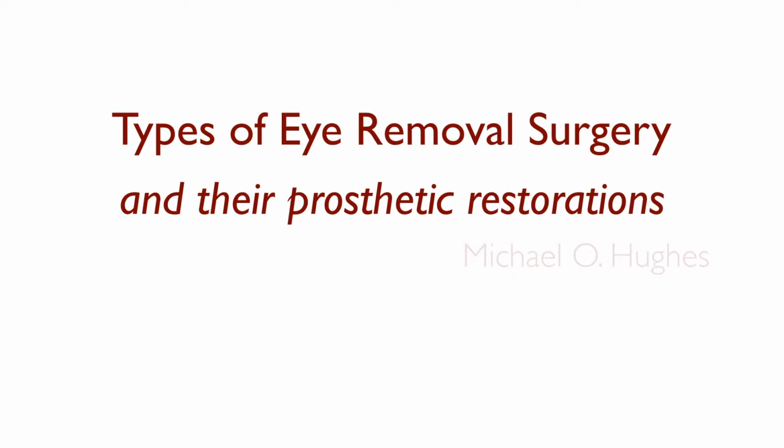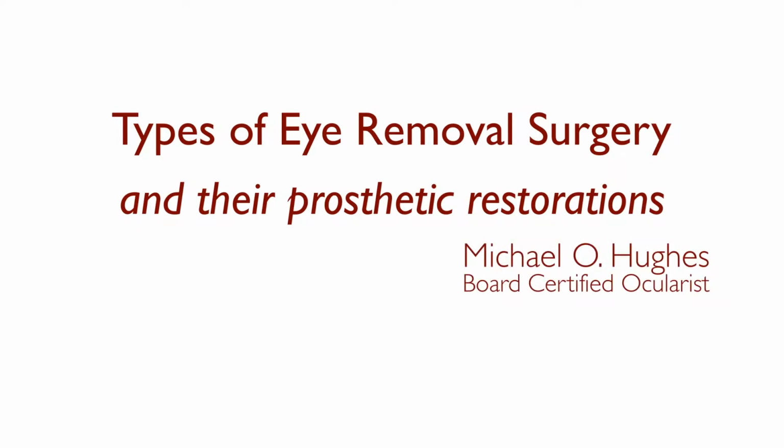Types of eye removal surgery and their prosthetic restorations. Eye removal is often a difficult choice for surgeons, patients, their loved ones, and their follow-up healthcare team. This animation is to accompany and clarify the paper by Michael Hughes in the Journal of Ocular Prosthetics and aid your understanding of their differences.